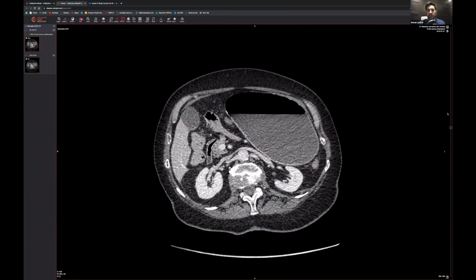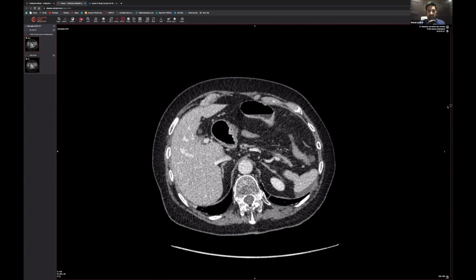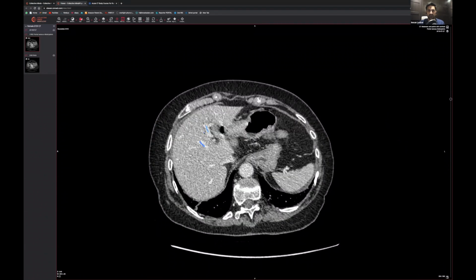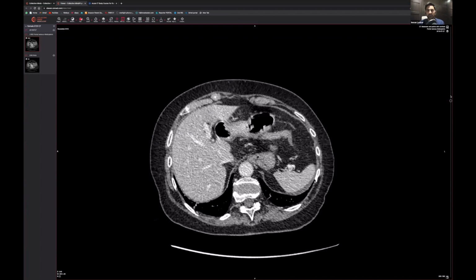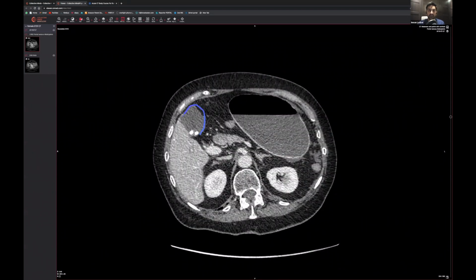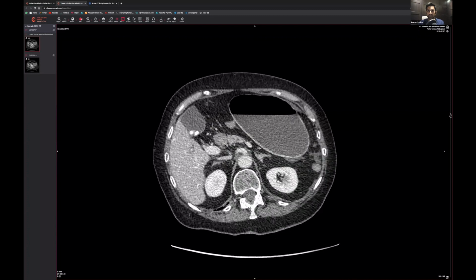It could be a biliary tract obstruction. But actually, when you look at the biliary tract, so what you look at the portal veins, and next to it, you can see the sort of radiolucency, right? That radiolucency there is more likely to be the biliary tract, but it doesn't look particularly large at all. So we're not really looking at intrahepatic duct dilatation. And when you're looking at that CBD, the gallbladder looks very, very thin. It doesn't look like it's particularly thick. It doesn't look like it's hyper enhancing. And around it, there's not very much in the way of fat stranding. So I don't think we can go for the gallbladder being the cause of the patient's pain.